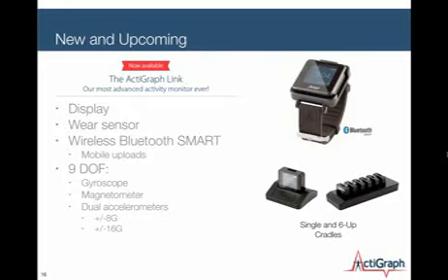I did want to also mention the cradles. We've had many requests to help us connect this to the computer in an easier way. We have done that with this device, providing a cradle to just drop the device into, and a 6-up cradle that allows you to connect up to 6 devices for simultaneous charging and upload.